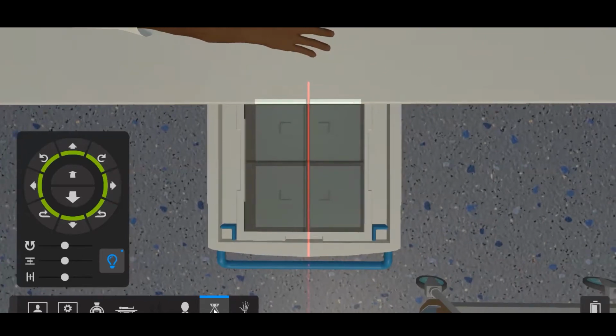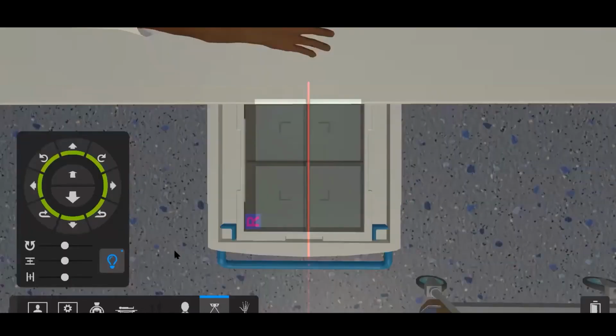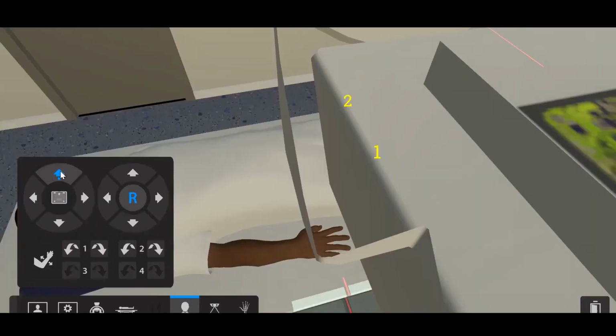And what I want to do is I then want to put on a right marker. I'll bring it across to that side. You might have just seen it down the bottom of your screen there. We'll leave it there. We might open that a little bit. Oops, wrong one, pardon me. Okay, so we're over collimated there, but I'm just going to get on with this because you don't want to watch me doing this all day.